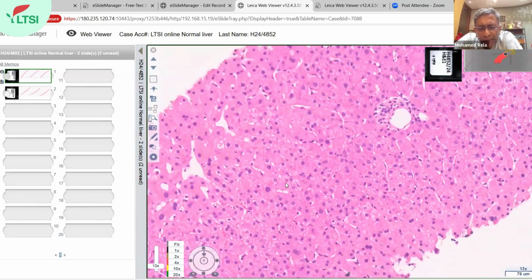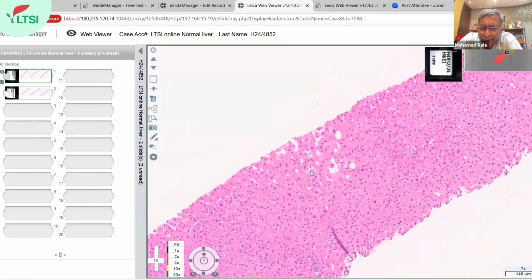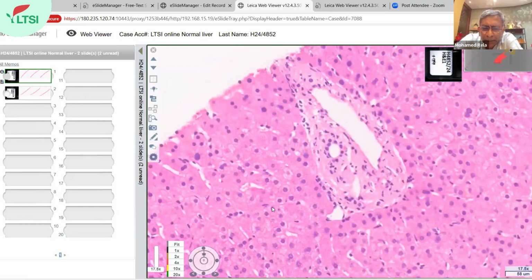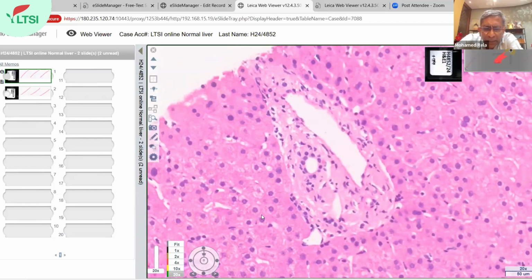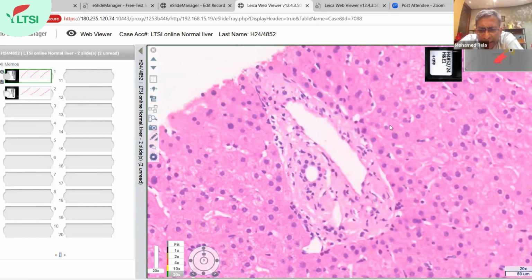Can you show a bile duct once again for them? Yes. A clean bile duct should be like a pearl necklace. Even this is not a very clean bile duct. You see there is some infiltration in this bile duct as well, and some eosinophilic material. So a nice, neat bile duct. This is a donor biopsy. I think there is some edema in the portal tract, so I wouldn't say it's a normal liver. This is a cadaver donor, I think. So this is what you see as a necklace.